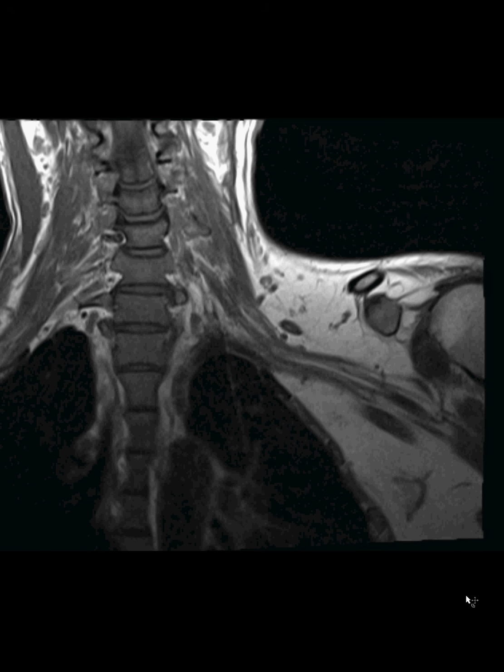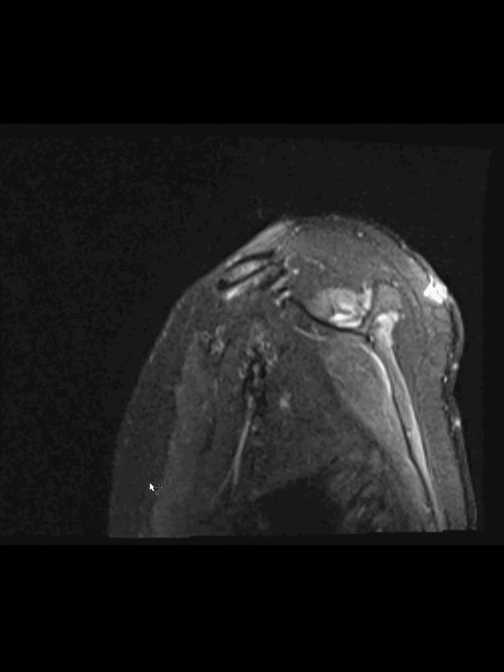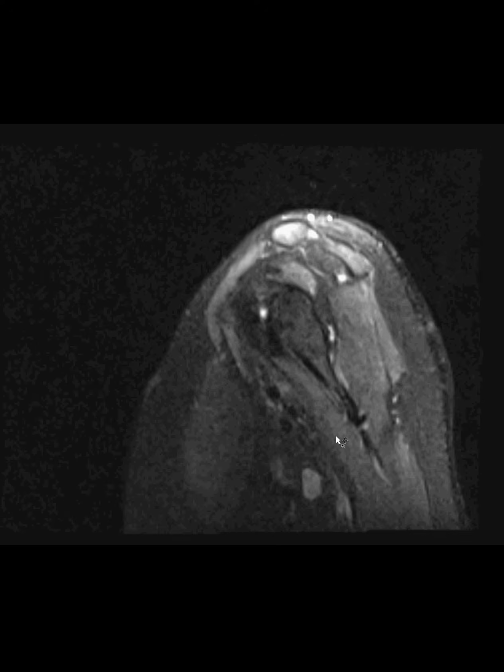Just one other thing I just want to show you just for interest's sake, I suppose, is we also look at the muscles. You can see the sort of edema in the rotator cuff muscles. This is a sign of a neuropathy and is helpful evidence to us and to the ordering doctors that there's something really going on, even when we don't see an abnormality in the plexus itself. Okay, I think that's long enough for this.